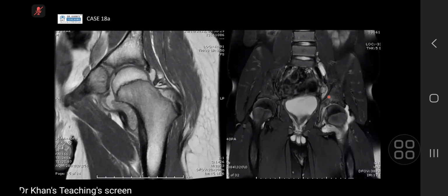Now, a small thing: we do MRI of the hip. We also look for other features. In this T2, there's probably irregularity of the chondral surface. It's probably just an incidental osteochondral lesion that's not associated with the underlying process.